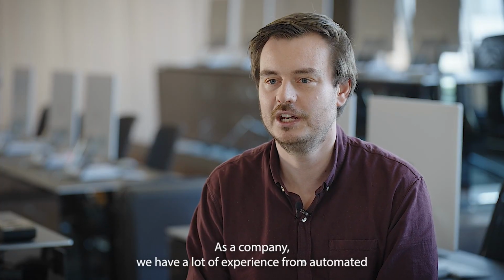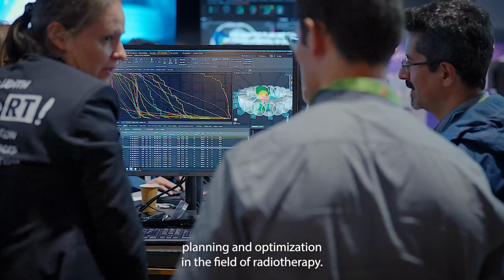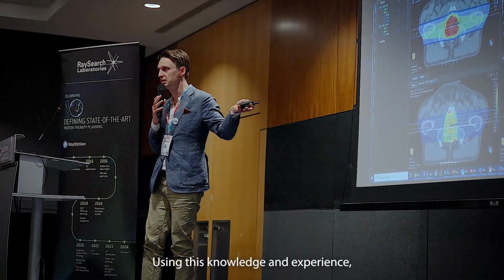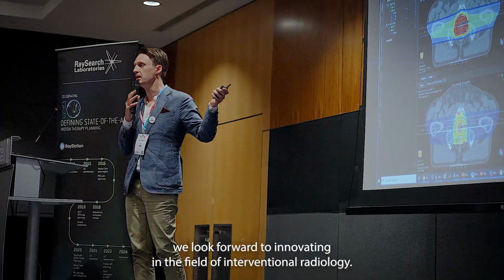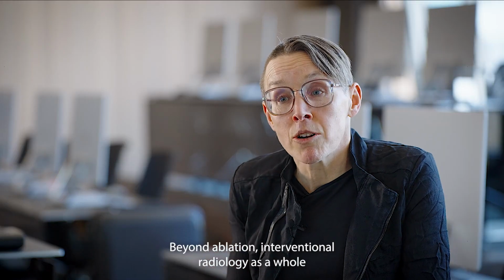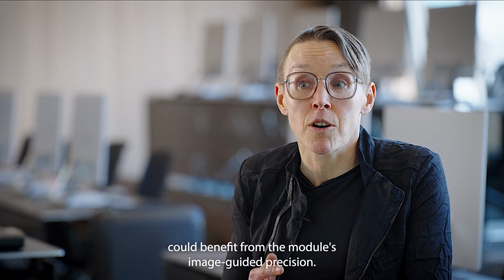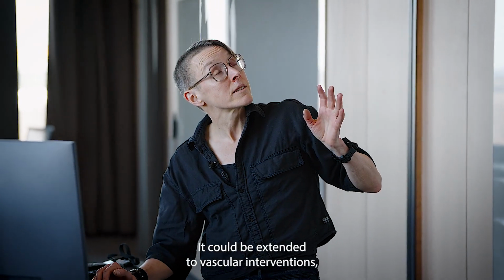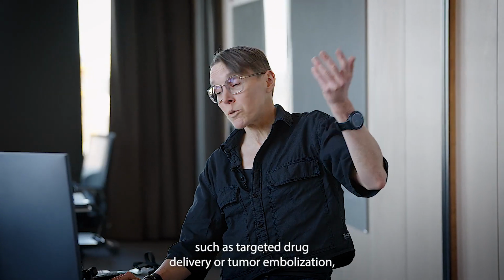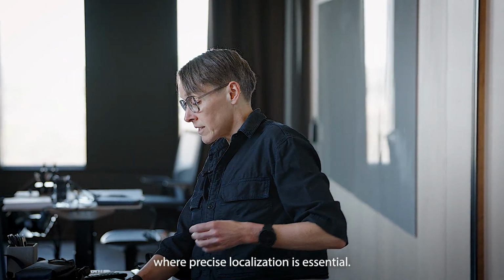As a company, we have a lot of experience from automated planning and optimization in the field of radiotherapy. Using this knowledge and experience, we look forward to innovating in the field of interventional radiology. Beyond ablation, interventional radiology as a whole could benefit from the module's image-guided precision. It could be extended to vascular interventions, such as targeted drug delivery or tumor embolization, where precise localization is essential.